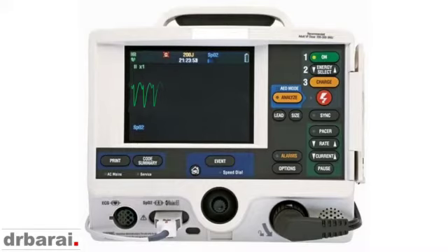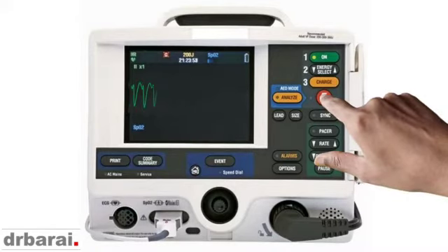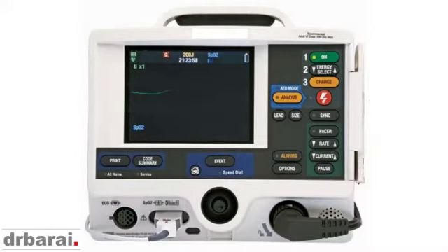And obviously, this is another shockable rhythm. So we delivered a shock, and the patient got a ROSC, or return of spontaneous circulation, and did very well. So with this type of rhythm, we need to keep in mind that this is a wide complex tachycardia, regular, until proven otherwise, this is a VT. Keep in mind that this can be due to some reversible causes, for example, hyperkalemia or sodium channel blocking drug overdose. So these are the two most deadly rhythms that we look for in the defibrillator machine.